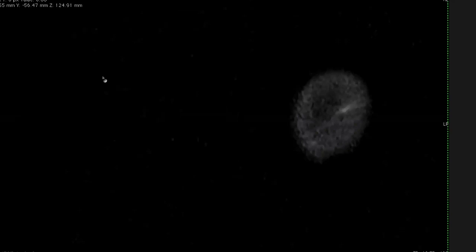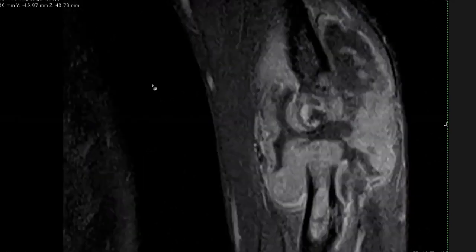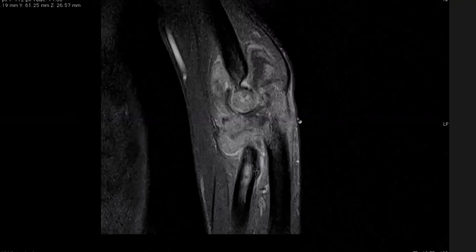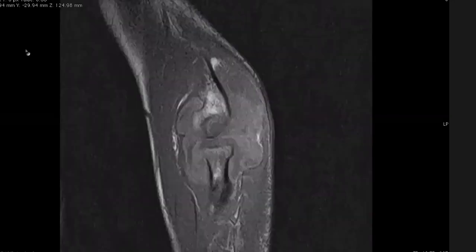So this is a post-contrast MR. Now watch out. Let's make it smaller. You see, it's a bit different than what I have shown you. It's got this lobular synovial enhancement, but there is focal enhancement in the capitellum. There's focal osteitis and infiltration into the bone. Usually tenosynovial giant cell tumor doesn't invade the bone like TB can. Infection doesn't respect bone, right?